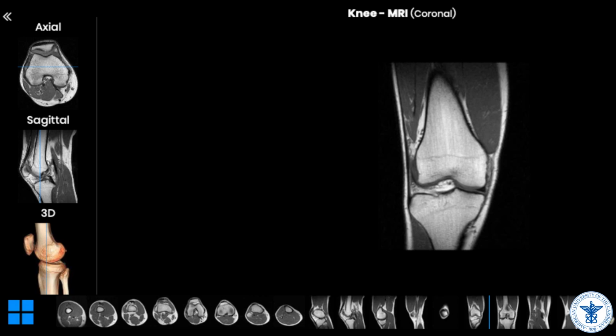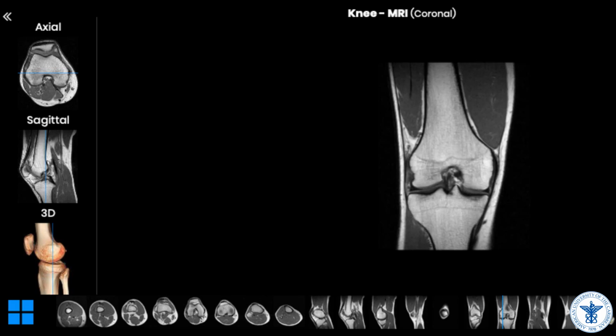The medial meniscus is appearing right now between the medial condyle and the medial tibial plateau. Here it is. And on the opposite, on the lateral side, you do see the iliotibial tract or iliotibial band, this dark line running down and attaching to the tibia laterally. The lateral meniscus appears on the lateral side as well.